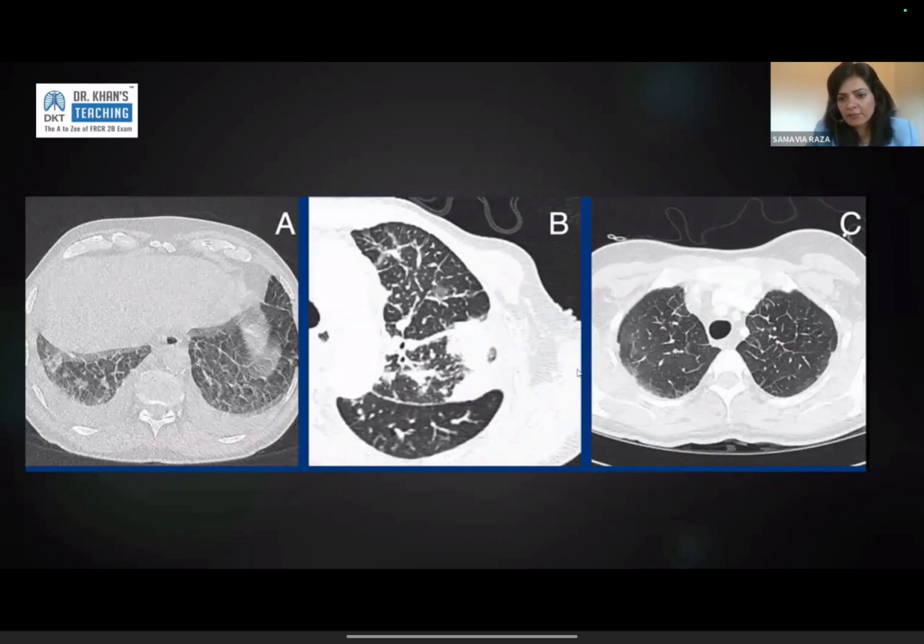B has consolidation, absolutely right. And some of you have said, Faisal, Shima, Kanchan, AN, and Donna, that none of them actually have ILD. And you guys are absolutely right. All of this is just septal thickening for another cause. This is smooth septal thickening. The subpleural lung looks very smooth and very normal, with septal thickening being more central. So this is septal thickening because of fluid overload, heart failure.